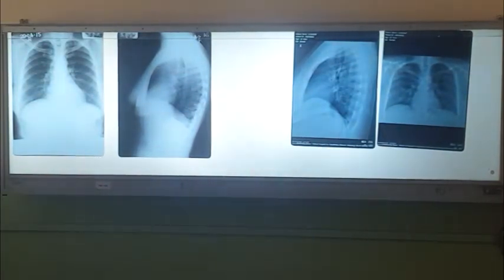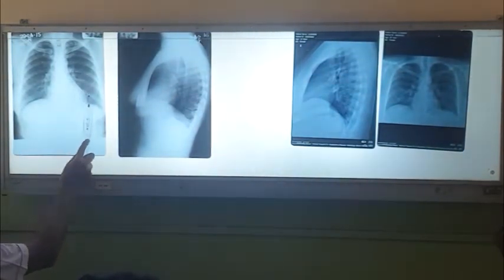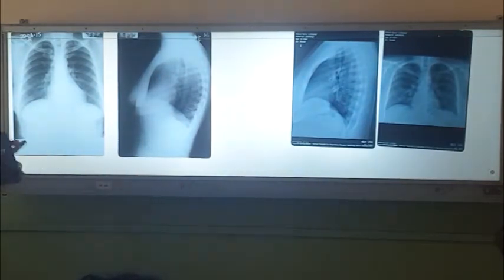And then this is the left ventricle. Next to that there is air in the lingular lobe. So if the lingular lobe is involved, this line will disappear. So if there is an opacity here and an intact left ventricular margin, that means the lingular lobe is intact, and there is opacity behind the heart, that is in the lower lobe, right? So this is how you assess.